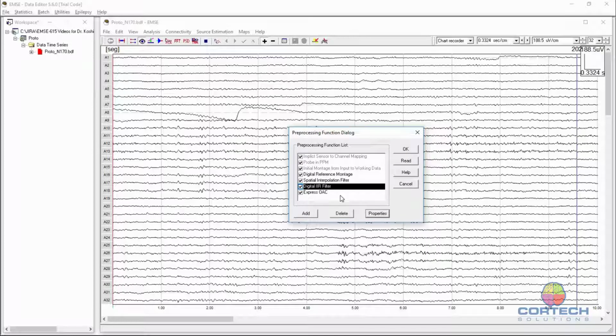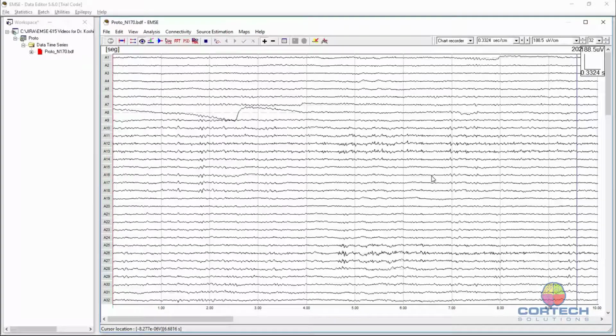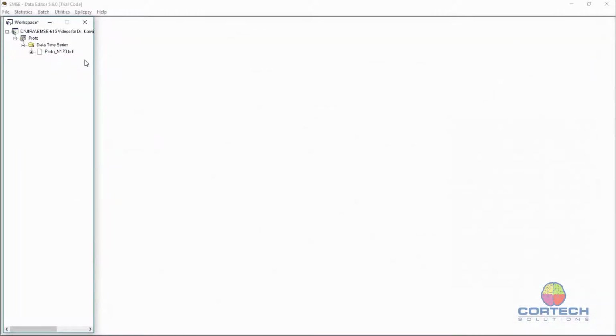All those filters were applied live to make some live averages, but on the other hand, these filters were not applied to the saved data. But we want to do so here. We want to treat the saved files all together. So, okay, let me unload this one.